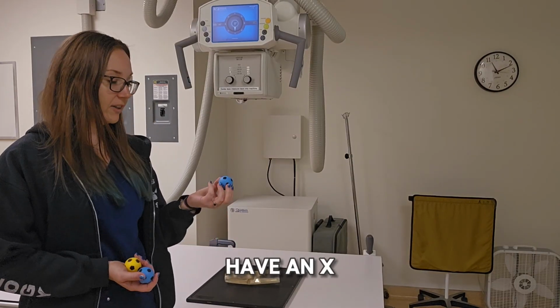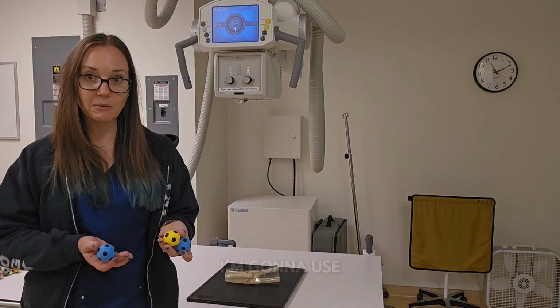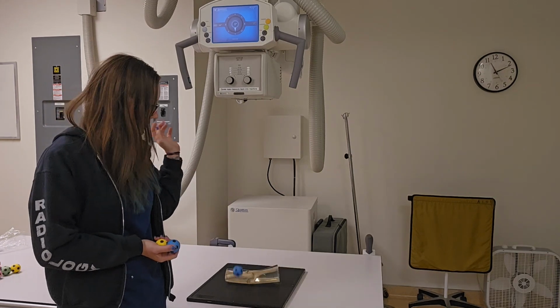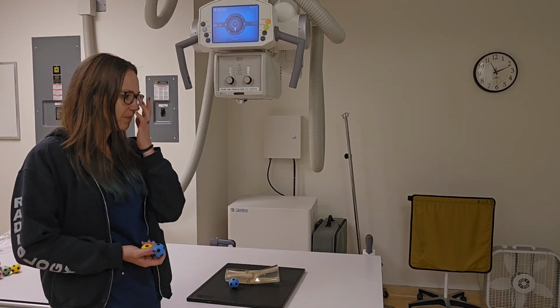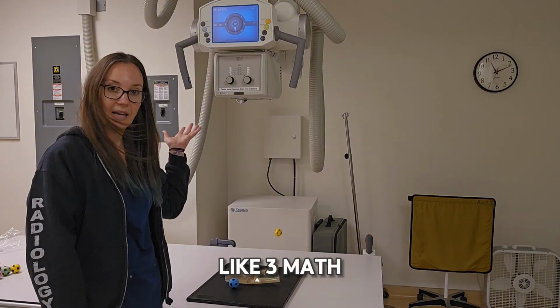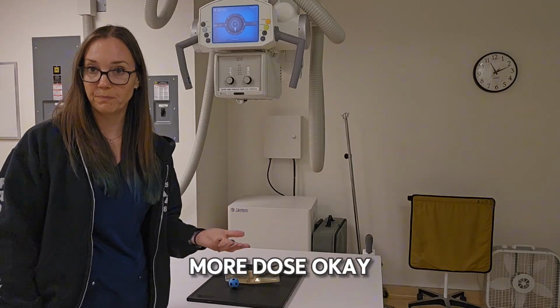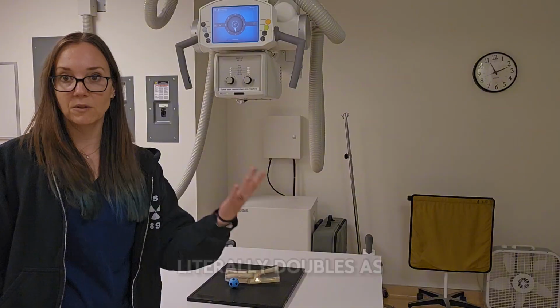So if I have an X-ray and I use one mAs, I'm going to use one ball. If I have an X-ray and I use 3 mAs, I'm going to use 3 balls, okay? So right now, if I use 1 mAs, this patient is only getting a dose of 1 mAs, right? As a patient, would you rather get 1 mAs or would you rather get like 3 mAs, right? As I add more mAs, I'm giving the patient more dose, okay? So the quantity literally doubles. Therefore, the patient dose literally doubles as I increase or double my mAs.